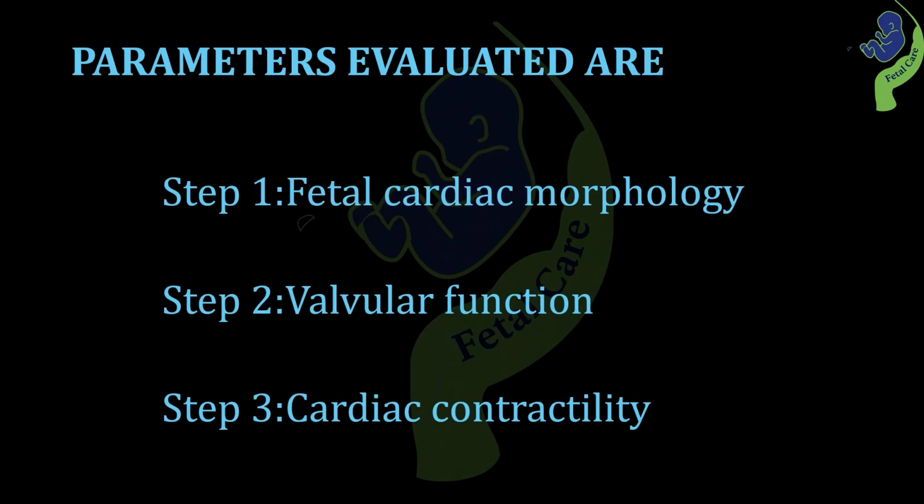When we perform a comprehensive fetal cardiac functional assessment, there are 3 broad parameters that we evaluate in addition to standard anatomical screening. The first step is fetal cardiac morphology, that is the morphometric evaluation of fetal heart. And this step will pick up the structural changes like cardiomegaly or myocardial hypertrophy, which are often the earliest signs of cardiac remodeling in a stressed fetus.